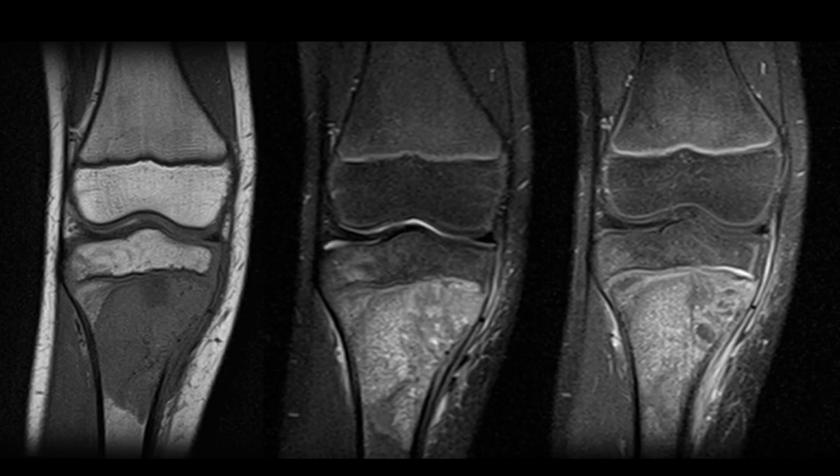Just to have an idea, we have an MRI with coronal T1, T2 fat sat, and T1 fat sat post-gadolinium. And the lesion here is actually more prominent, and looking in the T1, it actually looks like it's well defined. You can actually trace a pencil around it. In the T2 and T1 post-gad, it's not that well defined because there's so much edema and inflammation in the bone that you can't really see where it starts or where it ends.